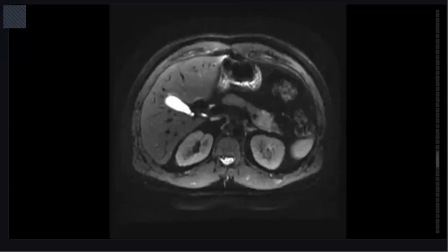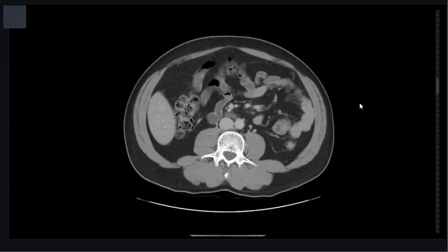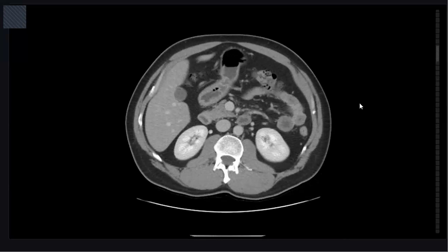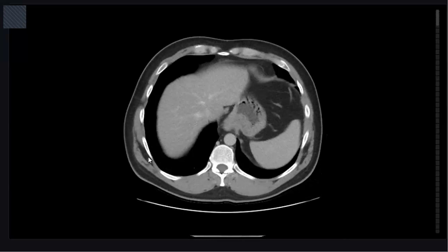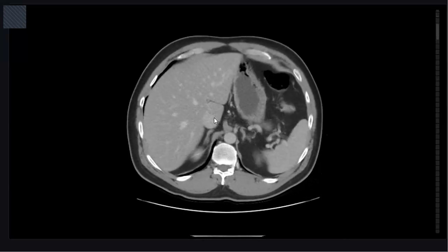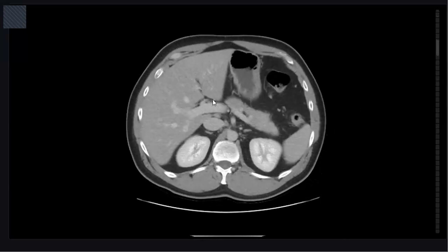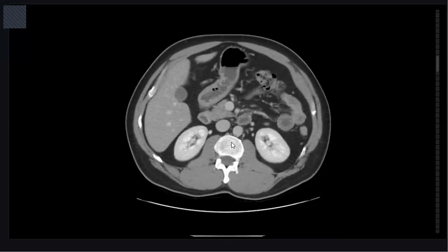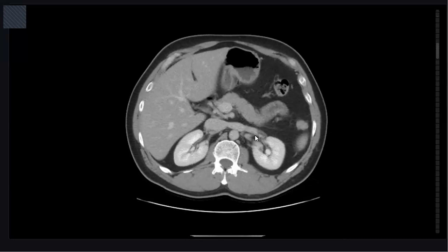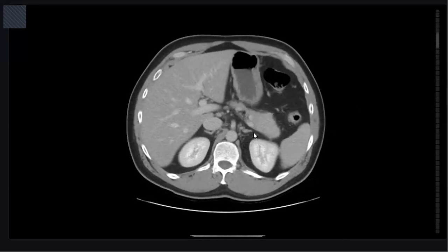Oh, this patient of pancreas. Okay. Here is the thing: if you are presented with an abdominal CT, try to go through the organs one by one first and quickly. Look at the liver, look at the suprarenals, and look at the pancreas, very important, and look at the spleen and the kidneys.